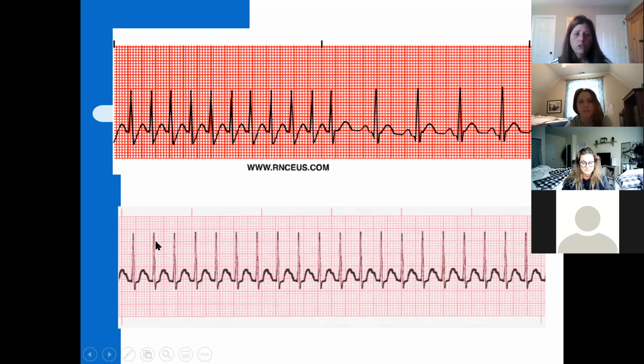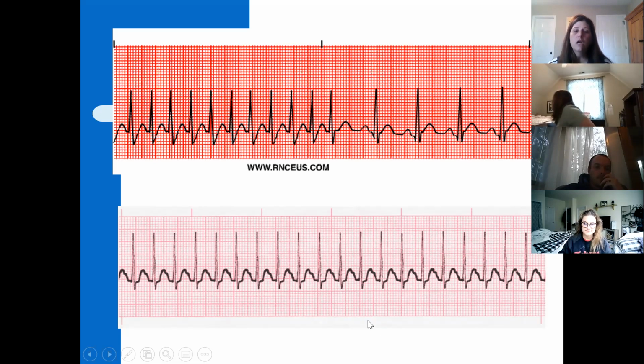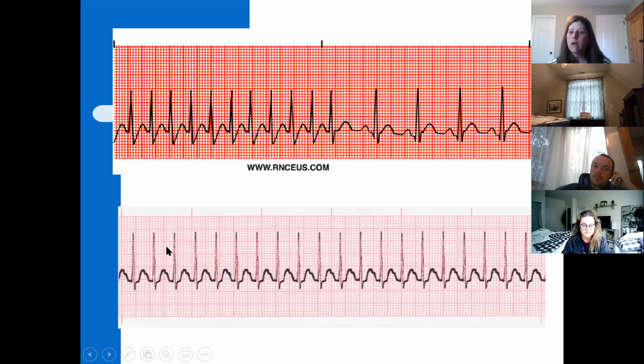So if we have 1, 2, 3, 4, 5, 6, 7, 8, 9, 10, 11, 12, 13, 14, 15, 16, 17, 18, 19, 20 times 10 for a 6 second strip is what? 200. Yeah, 10 times 20 is going to be 200, right? Your heart can't sustain that very long. That is not good. Now, we tend to see little kiddos run at a higher rate, right? But even over a long sustained period of time, they're not going to be able to handle this, right? So anyhow, you could see how it is very fast. It's definitely greater than 150.